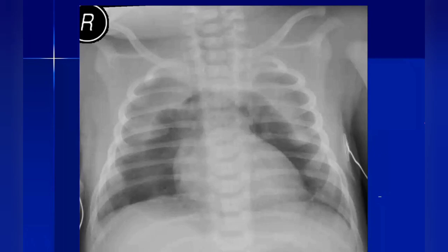Radiograph chest frontal projection of a skeletally immature individual. I can appreciate that there is extensive air which is outlining both lobes of the thymus, giving the appearance of the angel wing sign. The cardiac margins are well maintained and discrete. Heart size is normal. The visualized part of the mid and lower zones of bilateral lungs show adequate aeration, and the patient is premature. So findings are in favor of extensive pneumomediastinum, which is a surgical emergency, and I would like to inform the relevant physician.